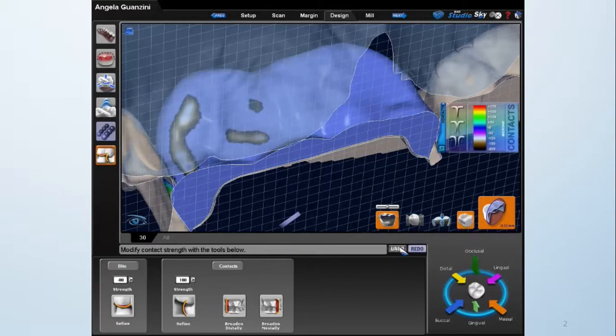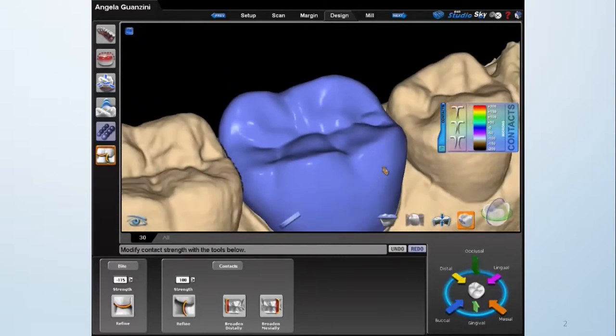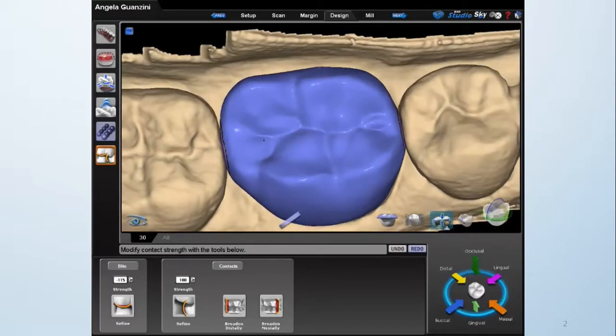So what I'm going to show you here is how to adjust to a different strength. So negative 80 microns is where the system's defaulted to. In my practice, we found at negative 115, when I took it to negative 115 microns, that my doctor had little to no adjustments. Okay, and that's what he was looking for. And if I still had a little bit of white in that area, there's another tool that I would use to really customize that.